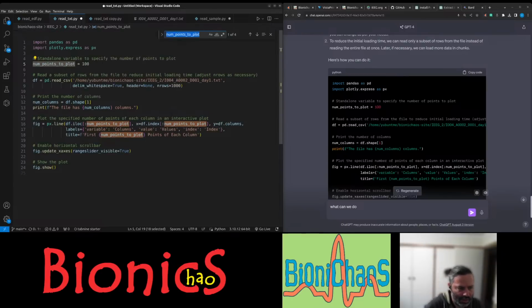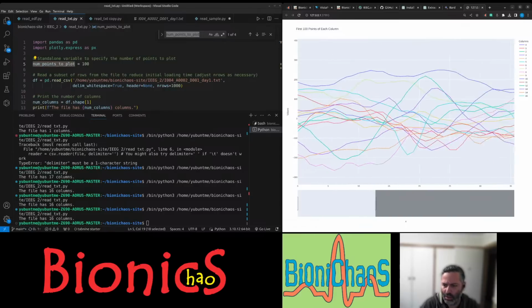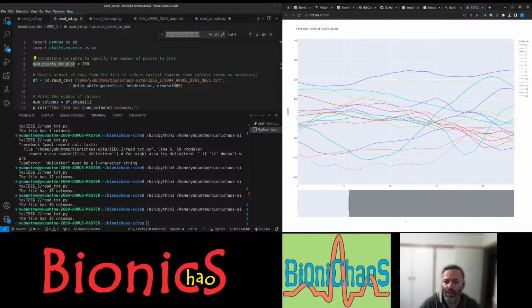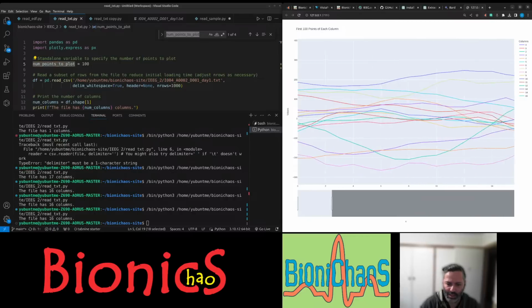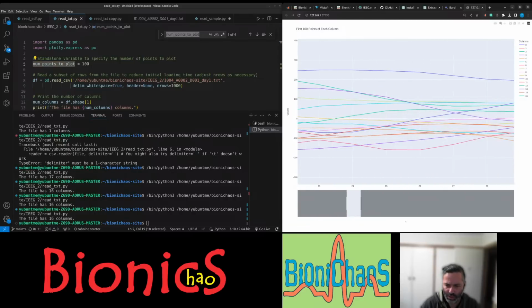So reading a subset, should it be? Okay, so this is much quicker. And we can do this. Okay, great. Yeah, having always this problem of the thing stretching.